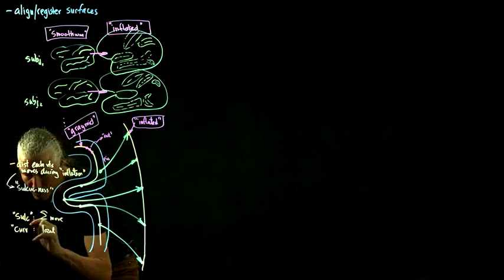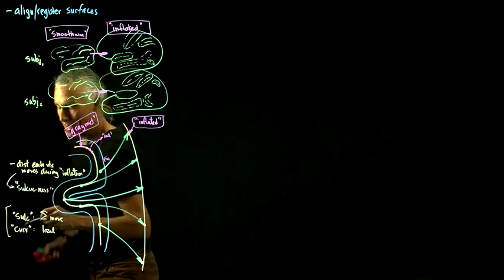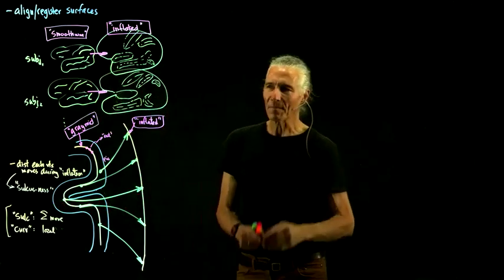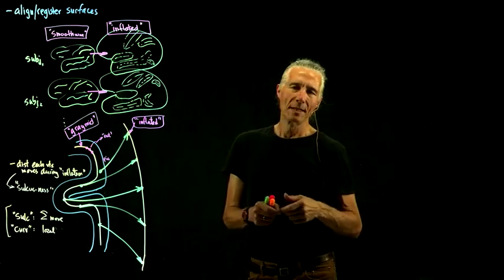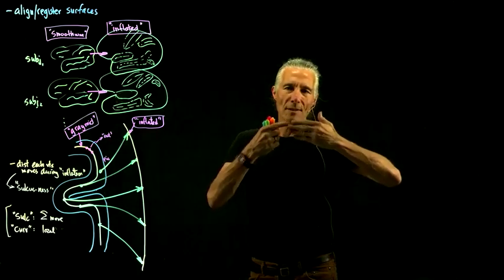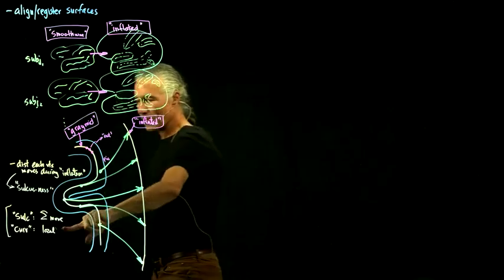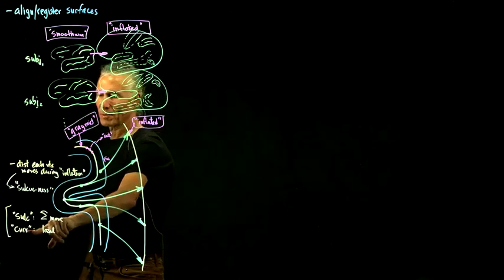You could try to use curve to align brains, but that's a very wiggly little thing. There are all these crinkles in the cortex as it folds, and those crinkles aren't particularly diagnostic of anything. They're idiosyncratic, different between different people, just how after a sulcus forms, it then crinkles up. The curvature will show you all those little crinkles, but who cares about them?